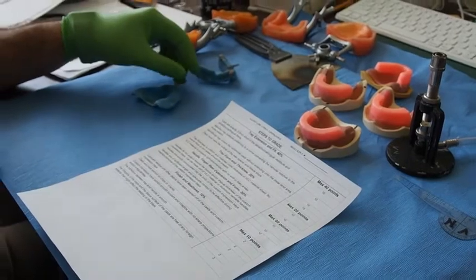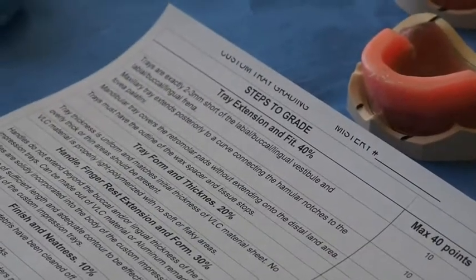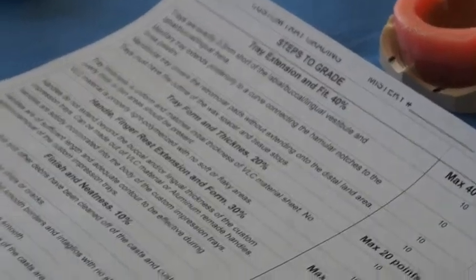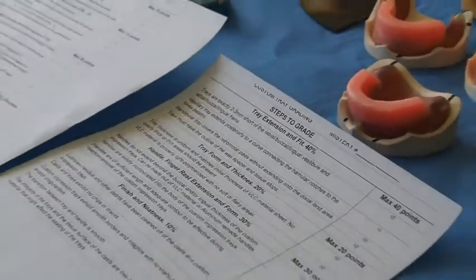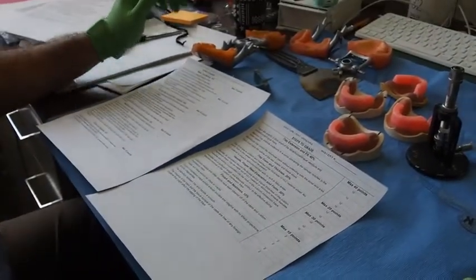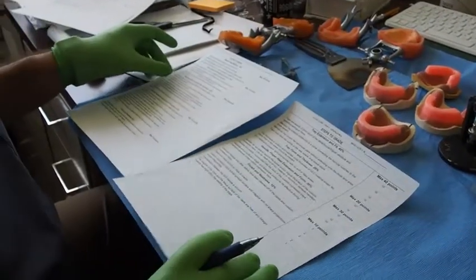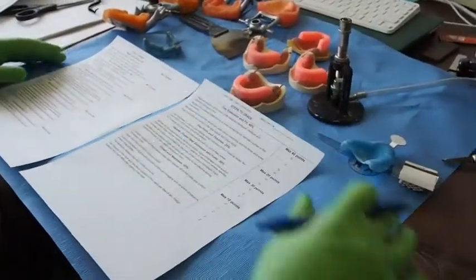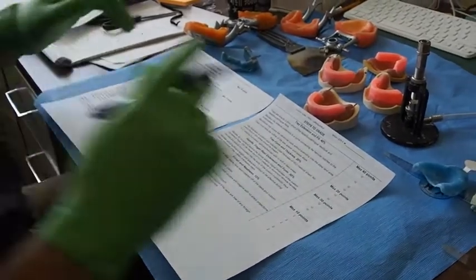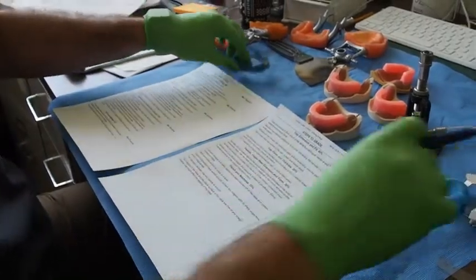So guys, we're recording this overview of what you need to do for the midterm practical. Dr. Van suggested doing this little overview to go over the steps of how we're going to be grading and what we're going to be looking for. So you can grade yourself. You just review these today, and then from there, you will be able to get a better score. Okay, let's get started.